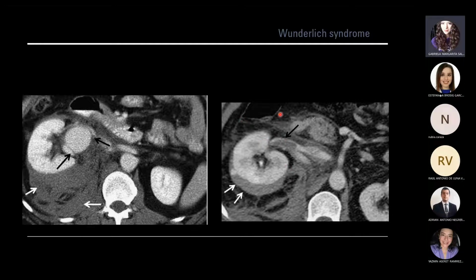52-year-old man with renal vein thrombosis. The axial CT shows a near-occlusive thrombosis of the right main renal vein with a perinephric hematoma.